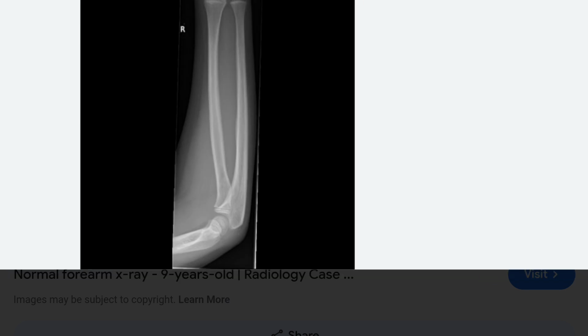What option will you discuss? Depending on preservation of joint, we can plan for open reduction of joint versus arthrodesis. Even after open reduction, there is a high possibility of remaining stiffness as there is capsular calcification with or without myositis.